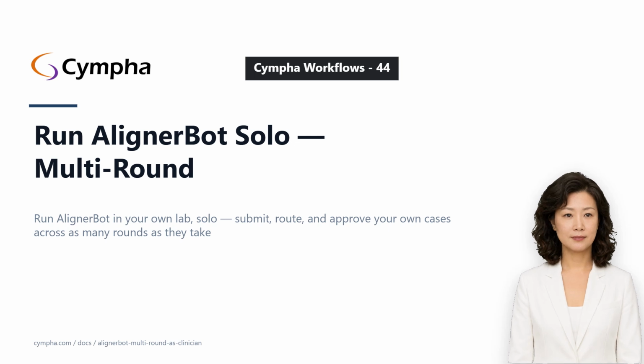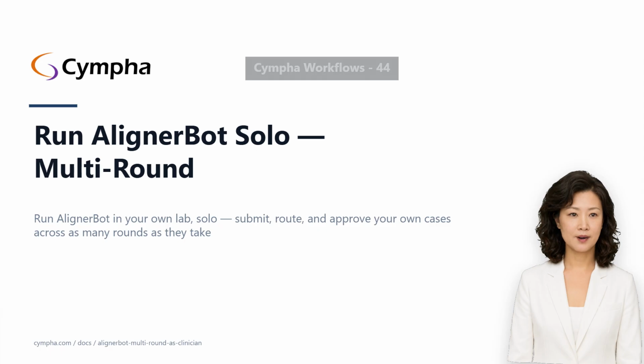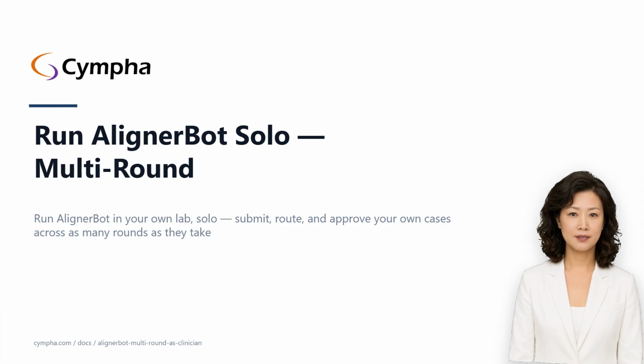Welcome to Guide Mia. Today we're going to talk about running AlignerBot as a solo clinician across multiple design rounds. This is for the clinician who has stood up their own Cympha lab and runs AlignerBot on their own workstation. You're the case owner, the lab manager, and the agent operator, all at once with no other human in the loop. I'll assume you've already worked through the AlignerBot lab setup and your pairing is live.